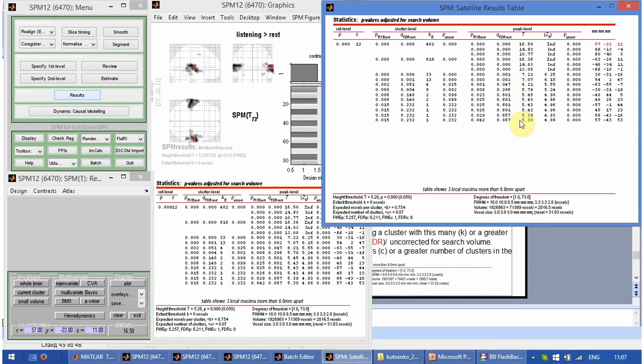This is a well-known statistical parameter. But we have about 2 million of those values. And those values are arranged in a 3D volume, absolutely similar to the functional image.